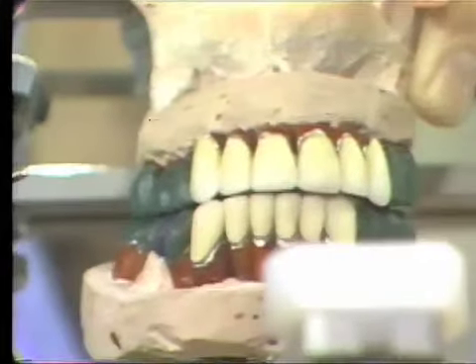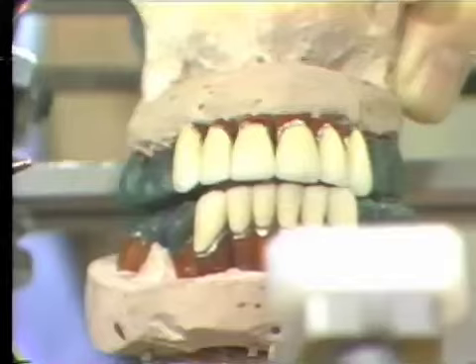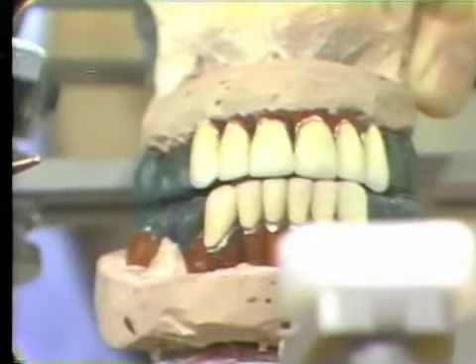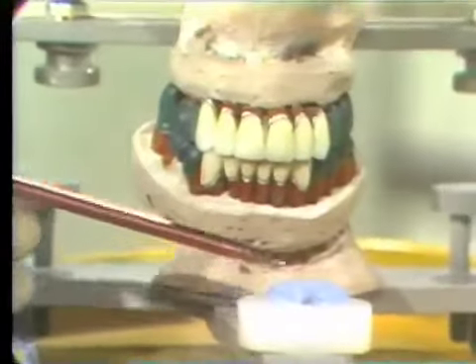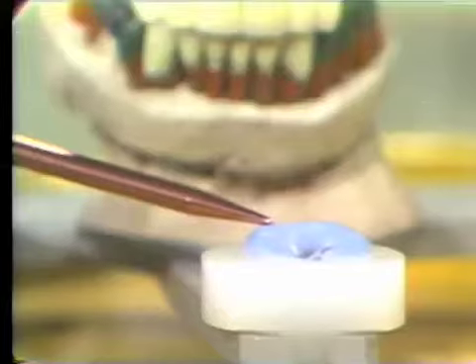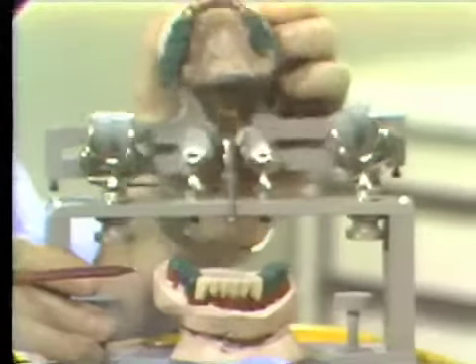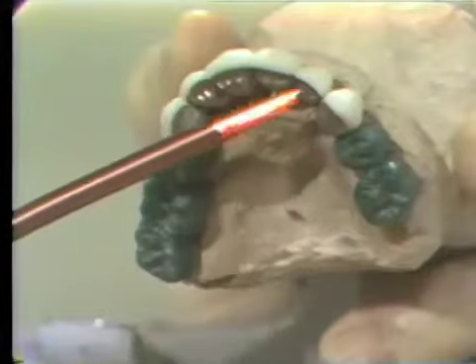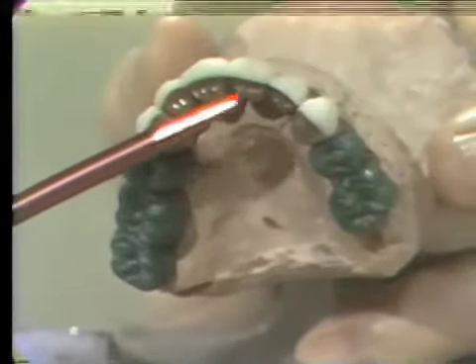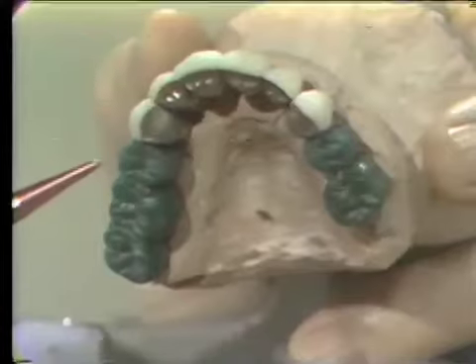We want to make sure that the anterior guidance is designed to clear the posterior teeth in the working and the balancing. Remembering that generally the incisal guidance from our incisal guide table is straight and the lingual surfaces of the anterior teeth will be curved. So it's important to get the anterior guidance established on the lingual surfaces of the anterior teeth at this time. We have established the centric stops in gold on the lingual surfaces of the maxillary anterior teeth for our contact. And then we have our porcelain for our aesthetics. So we want to go in here now and adjust the anterior guidance to what we want in the mouth.